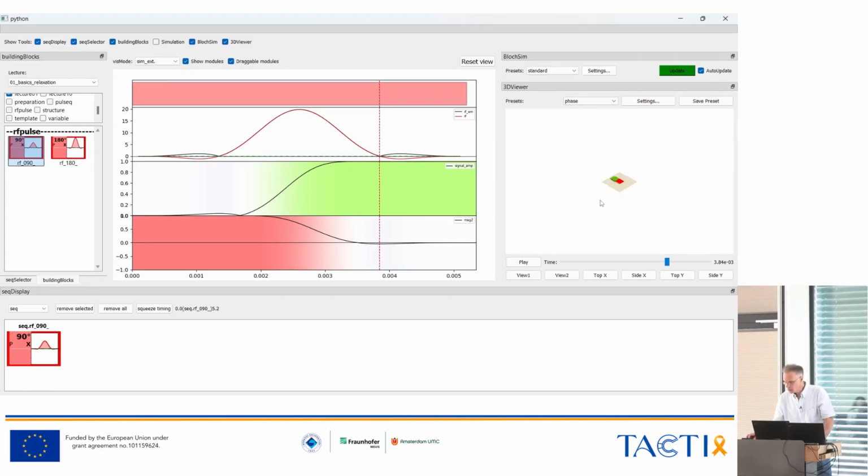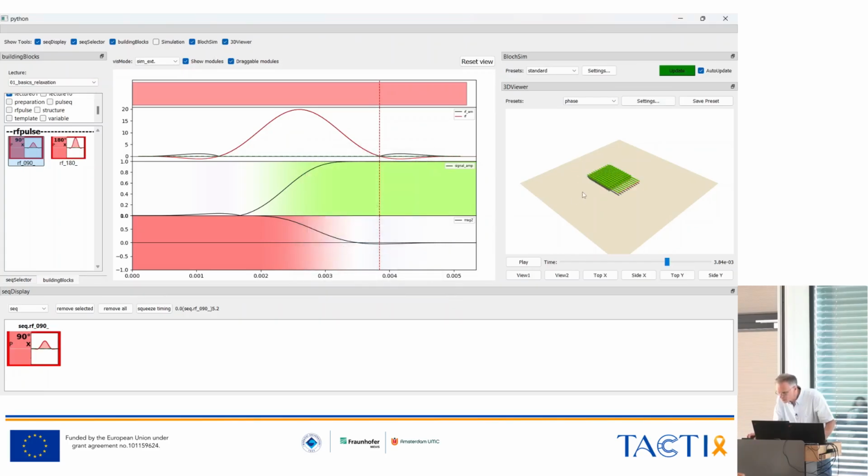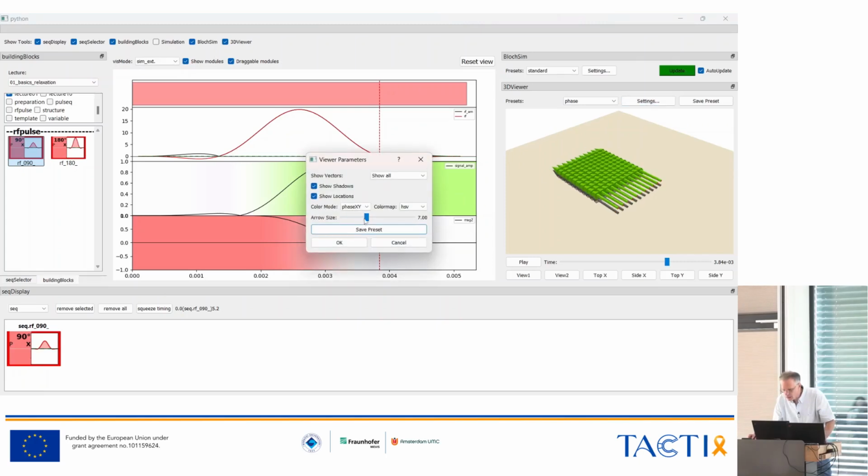Oh no, I switched to another setting, which has a stronger magnetization, sorry. So then the spins will have exactly the same color as in your sequence diagram here.